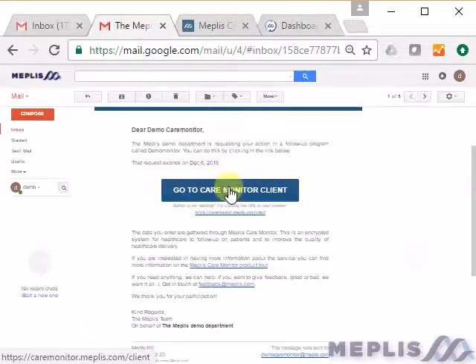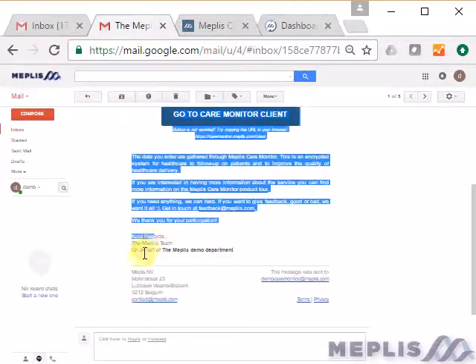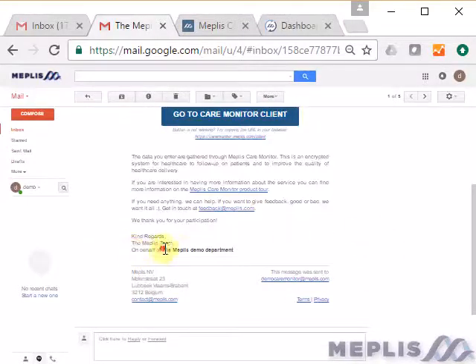So you can see here, I have the link here. I have some explanation about what Caremonitor is. You can take a product tour if you're interested. You can provide feedback, and you can also see that this email is being sent on behalf of your organization name. It was also sent to democaremonitor@meplis.com, which is my user.